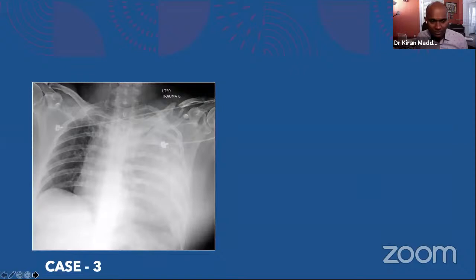Okay, moving on. Now you should be able to answer this pretty quickly. What is the diagnosis, one, and what else do you find in this patient?